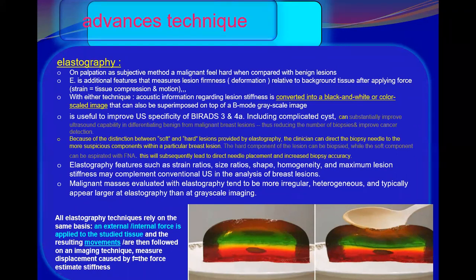Before interpretation, it helps in a mass with heavy posterior shadowing. On elastography, it demonstrates the whole margin of the lesion.